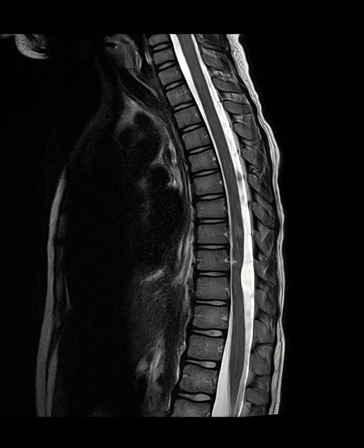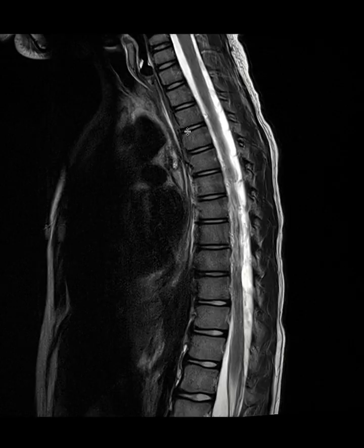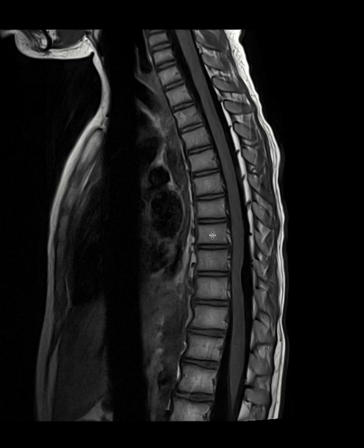This is again a cervical and thoracic spine MRI, and this is a T2 sequence. The difference between this one and the other one I just showed is the fat brightness, so this is a regular T2 sequence. Again, we see a smooth indentation in the posterior aspect of the cord. There is some sort of lesion here that is exerting mass effect, and it's very smooth. So far we have a lesion that is T2 bright. Let's look at a T1 sequence.